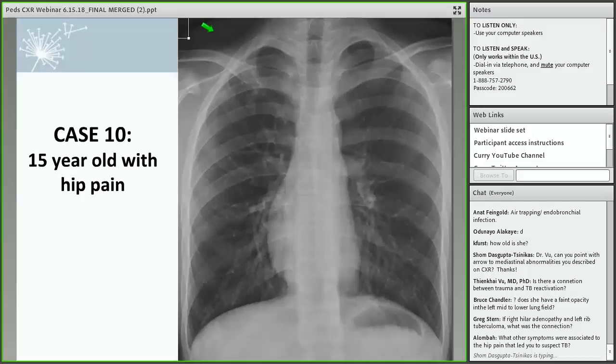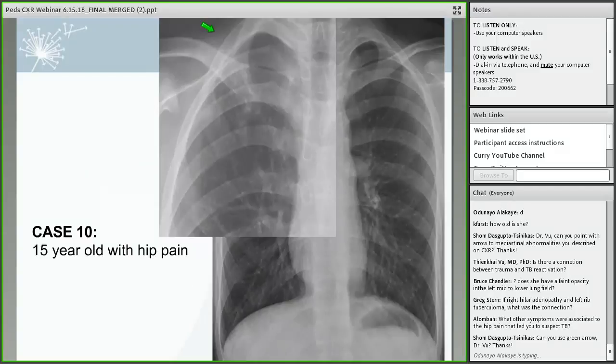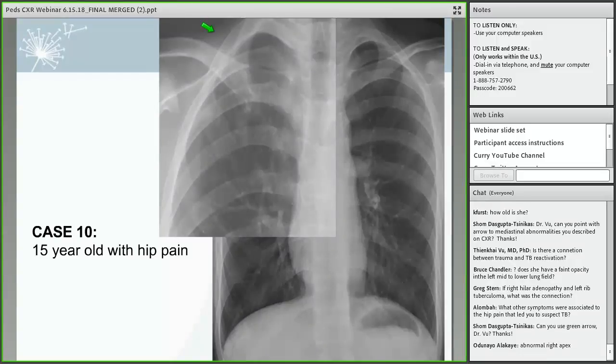lower lung. But when you look in the upper lung, it's a little bit tricky in that over the right first rib, you can see there's some linear, maybe a little bit nodular density overlapping the first rib and the clavicle. So there might be a finding there, particularly when compared to the left, where you don't see those findings. And then there's a blow-up image, and once again, I think you can confirm that there's some linear, maybe slightly nodular density overlapping the clavicle and the right rib.